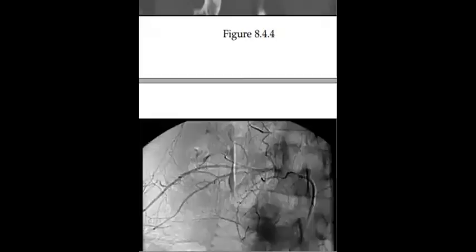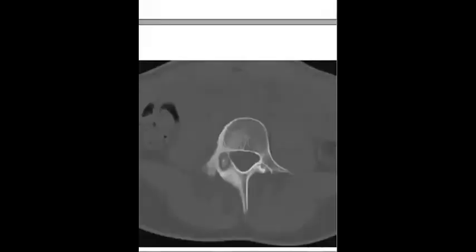The usual age of osteoid osteoma is between 20 to 30, with male predominance. Osteoblastoma may be at a younger age. I mentioned to you that when you see painful scoliosis, as in this X-ray, or scoliosis with sclerosis in one of the pedicles, it gives you a clue to think of other differentials than metastatic lesions. You know that the pain responds to non-steroidal drugs or aspirin.